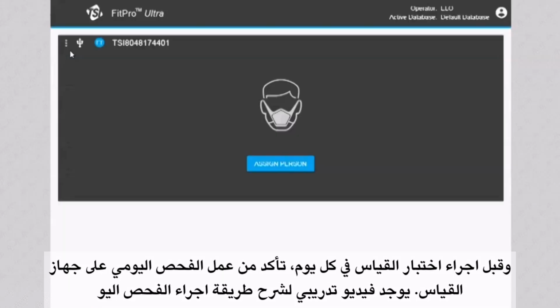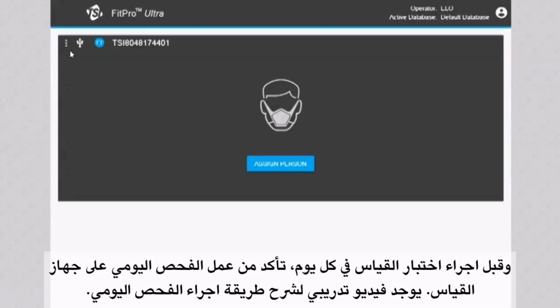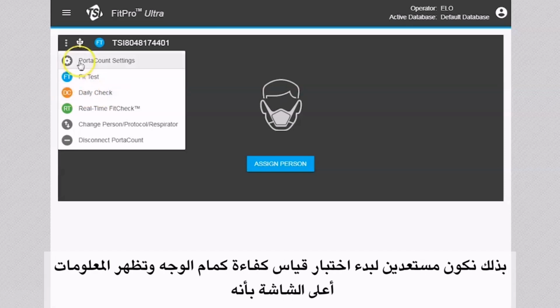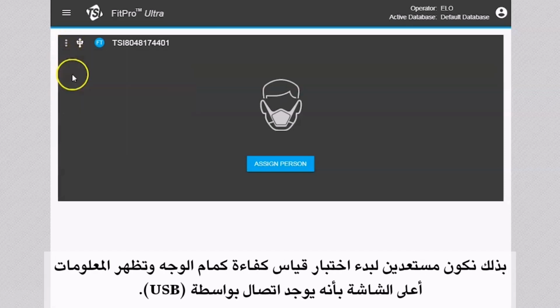Now make sure, before you do any fit testing, that you've gone through and conducted a daily check. You need to do the daily check before you start fit testing for the day, and we have a video on how to do that. So, we're still here at Fit Tests, so this is getting ready to fit test.